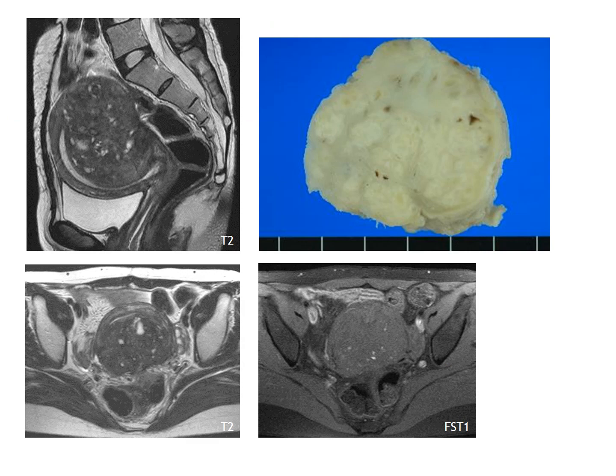Here is another case of diffuse adenomyosis in the posterior myometrium. We see heterotopic endometrial tissues and the smooth muscle hyperplasia at T2-weighted image and the extent of hemorrhage at T1-weighted image. These findings are well correlated with gross specimen findings.